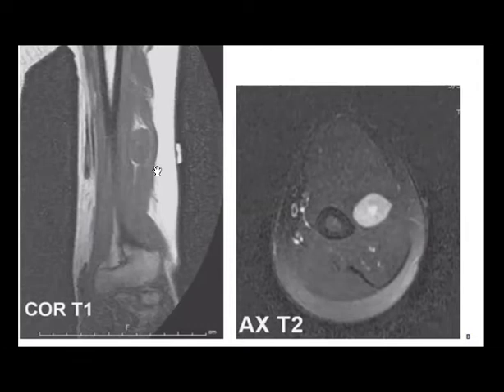Neurofibroma will be more common, and the patient, as we mentioned, will have paresthesia and a slowly growing pattern. So this patient will have an enlarging mass, but slowly growing. Myxoma, Shayma, is a very good differential to put. Schwannoma arises from the epineurium of the nerve, and the fusiform appearance gives you the impression that you are talking about a peripheral nerve sheath tumor.